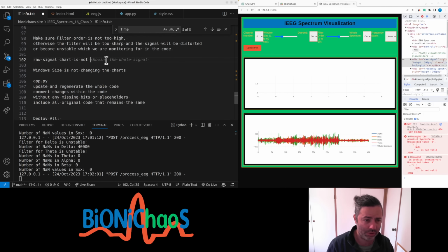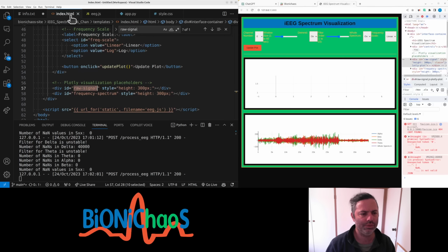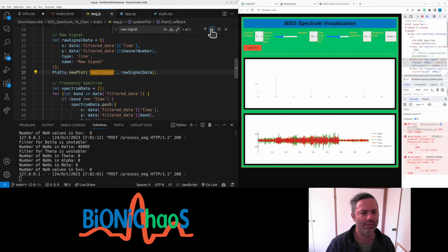It's not showing any signal. Raw signal, it's the ID.